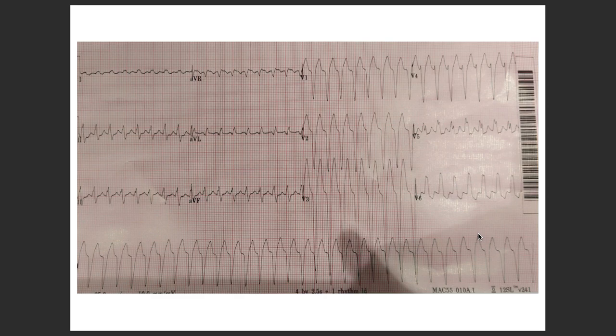This is a practical ECG. It's concordance where they're all sort of raised in one region. Wonderful. Exactly. Are they in agreement with each other or not? Are they pointing in one direction or not?